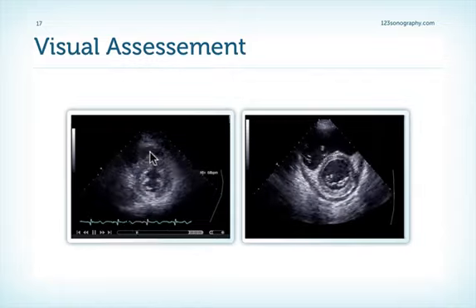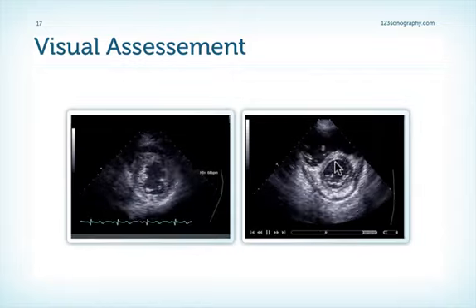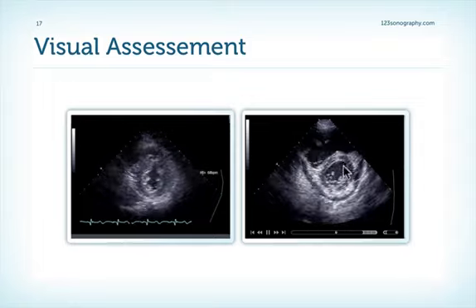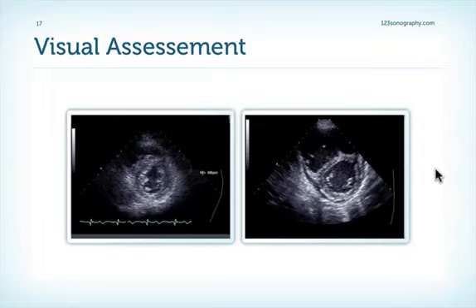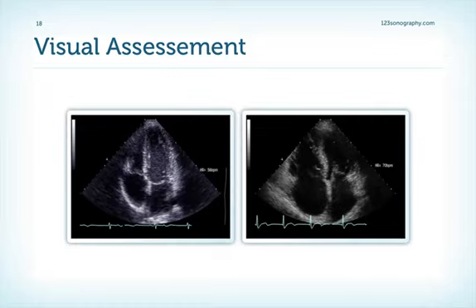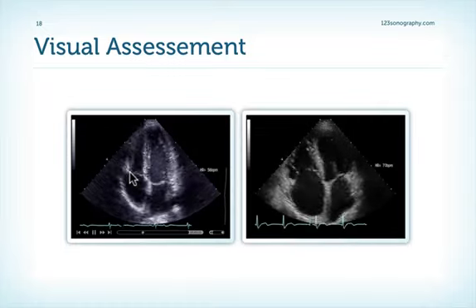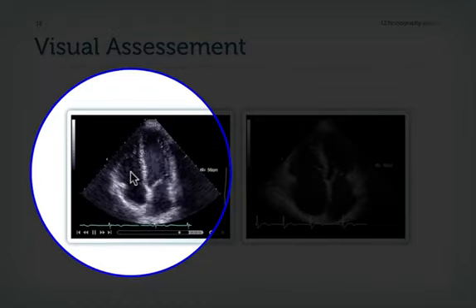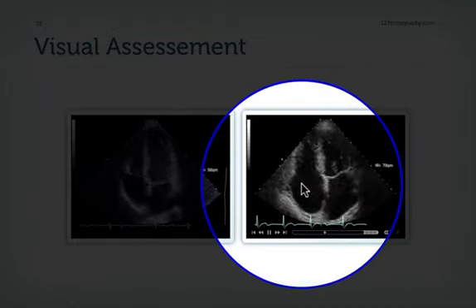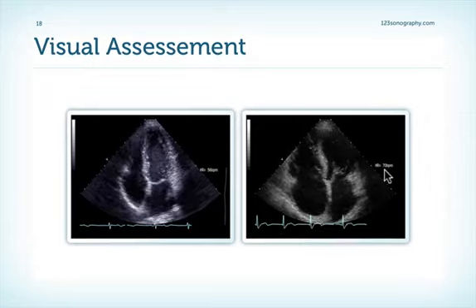Here we have a patient with a normal or small right ventricle actually, and a patient with a large right ventricle which is larger than the left ventricle. You can do that also in a four-chamber view, or actually even better in a four-chamber view. Again, two examples: a normal right ventricle, and a dilated right ventricle, which is larger than the left ventricle.